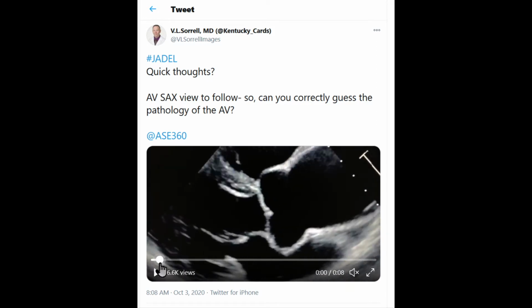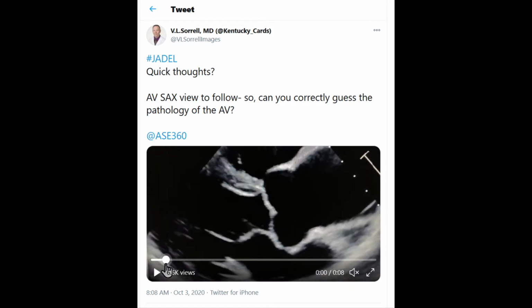In this particular case, I think everybody was struck by the fact that the aortic root looked big. For novice echocardiographers, the aortic root is typically about the same size as the left atrium. So when you see an aortic root that's twice the size of the left atrium, that's a clear marker of dilatation. There are also centimeter markers over here, and you can see that this exceeds 4 centimeters, making this a dilated aorta, regardless of how big the patient is or what method you use to index the aortic root.